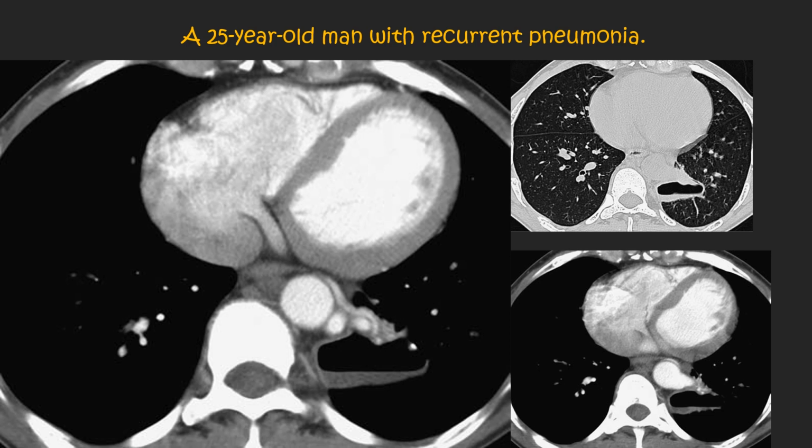A 25-year-old man with recurrent pneumonia. These are the images. What is your diagnosis?